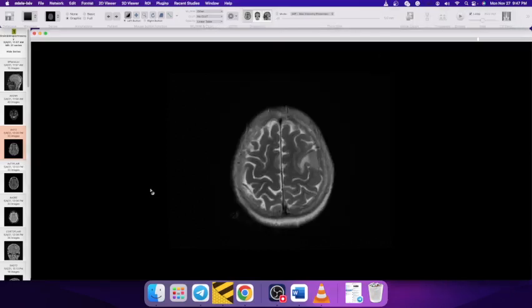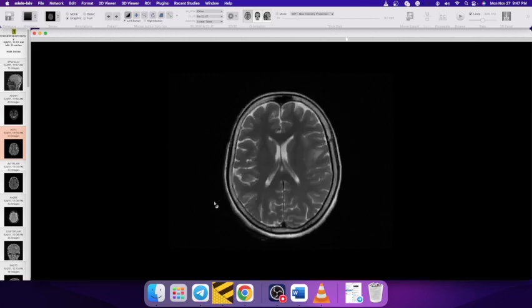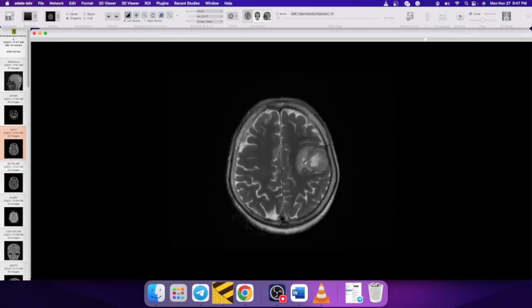So today we'll discuss an MR brain of a female who came with headache and eventually got an MR with contrast and spectroscopy done. We initially start with the T2 weighted images in this particular case, and we see that there is a solid lesion which is iso to hypointense on T2 weighted images with central areas of hyperintensity and peripheral areas of high signal also. And this lesion is in the periphery of the left frontal lobe at the region of the frontoparietal junction.